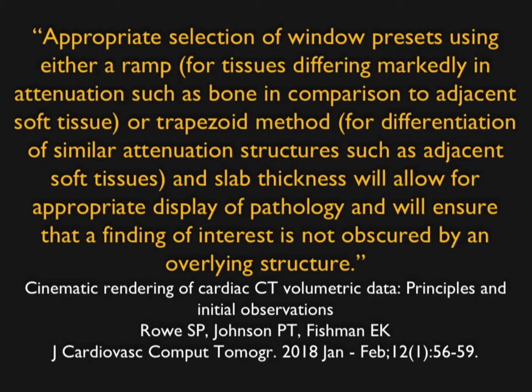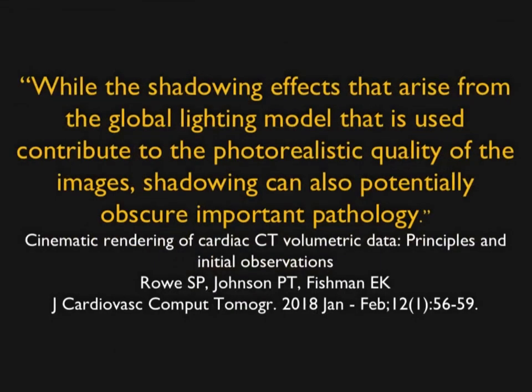You can have really crappy cinematic images. So it's very important to be able to really get good presets. As I said, I've spent 2 years developing presets. With the shadowing effects that arise from the global lighting model, again, this idea about good versus bad: we can show things well, or we can hide things, no problem.